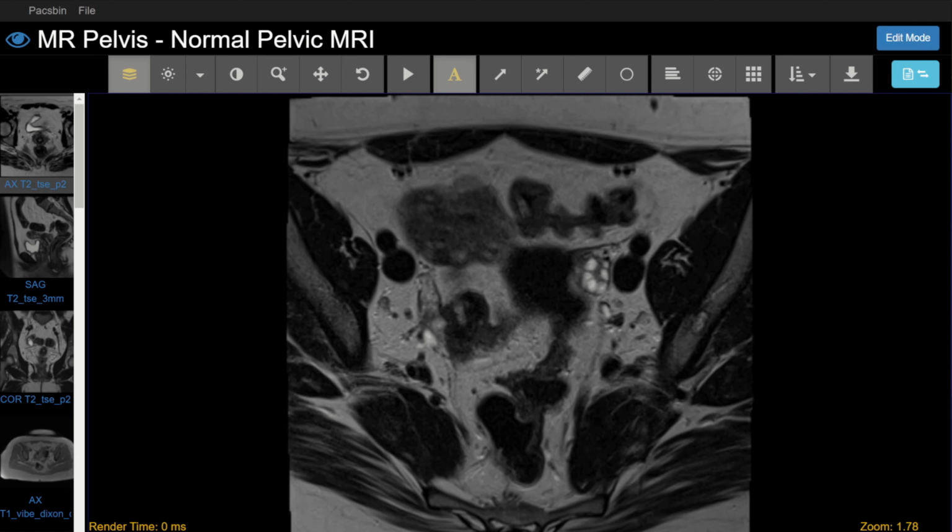If you still can't find them, you should look for, again, the suspensory ligament itself with the ovarian vasculature in it, the round ligament as well. So the round ligament is here, this T2 hypointense structure that extends from the uterus and through into the inguinal canal. Here it is on the left. And the ovarian ligament, which extends between the uterus and the ovary itself. So that's it here. And at the junction of all three, you should generally find the ovary.